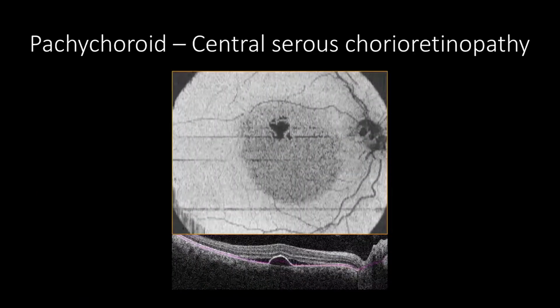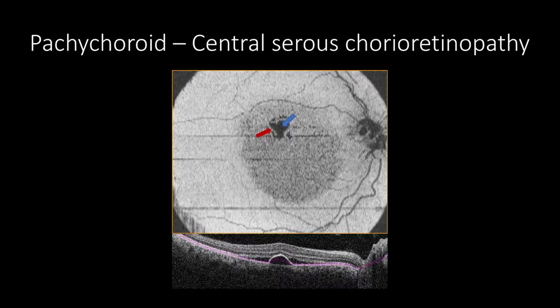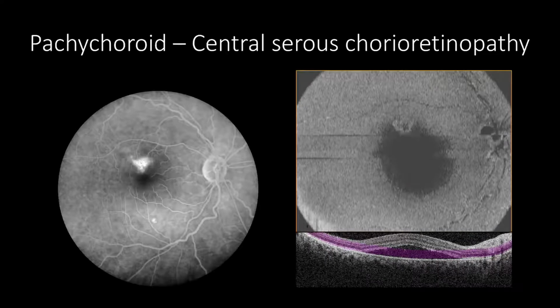In cases of central serous chorioretinopathy, pigment epithelial detachment will appear as an area of hyperreflective borders with hyporeflective content. A segmentation of subretinal fluids containing the PED or RPE alteration will show increased reflectivity corresponding to the area that shows leakage in fluorescein fundus angiography. The IPL-INL layer shows hyporeflective cystic changes only in cases of central serous chorioretinopathy associated with intraretinal cystic changes.